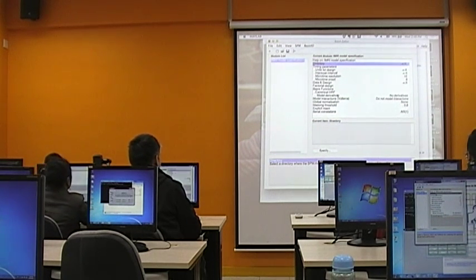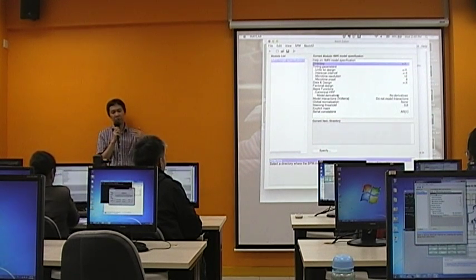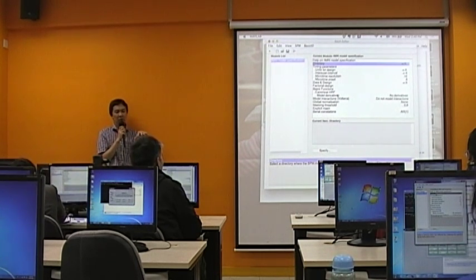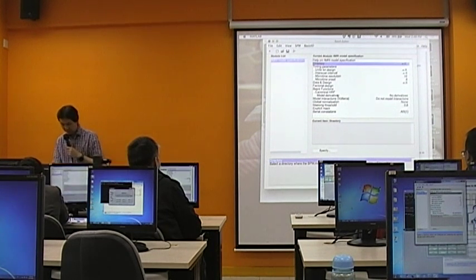The other thing you need to know before you start your analysis is the onset of your events. Because you have an experimental paradigm, and you will need that information to build the design matrix, which is the combined regressors or expected signals of your condition of interest plus the condition of no interest. So here, first of all, you need to specify a directory.